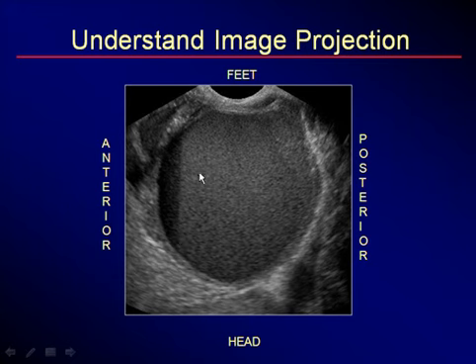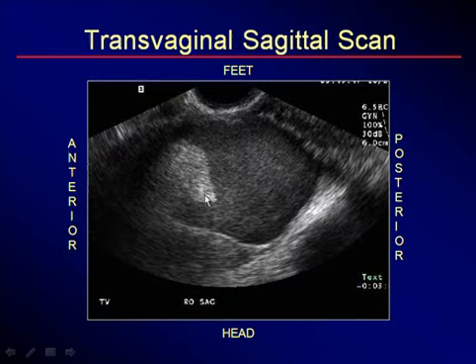And here's an adnexal mass, a sagittal image of an adnexal mass. We know this is anterior, we know this is posterior. Our level shows us that dependent material is to the posterior, and even though the level's up and down, we still know that's dependent. That helps solve complex cases like this one, where the echogenic material is on the non-dependent portion, which means it's floating. So now, once we make that decision, we know this is anterior, this is posterior, this is floating. Fat floats. We now have a 99% diagnosis of a dermoid.